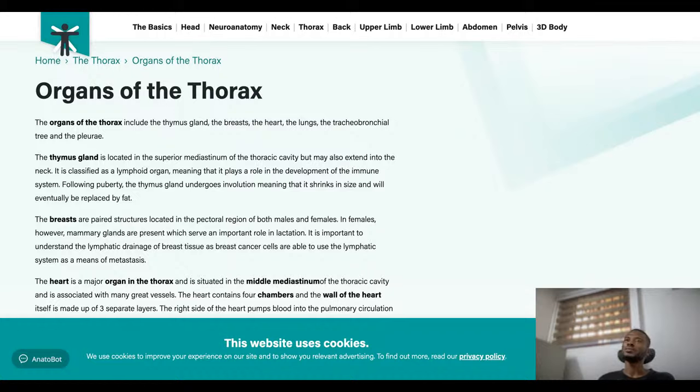Sometimes, if the exposure is not high enough, if you underexpose the image, you will not be able to see the thoracic vertebrae behind the heart. And I told you why the heart appears so opaque. It is because of what? The calcium ion that is in the heart. And it is the calcium ion that causes the heart to undergo its spasms that lead to the contractions.